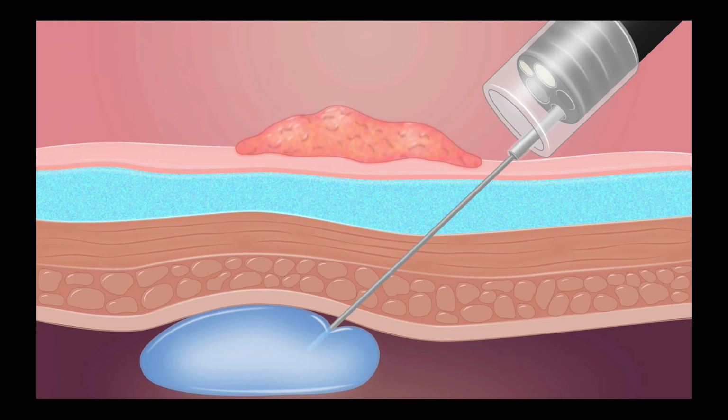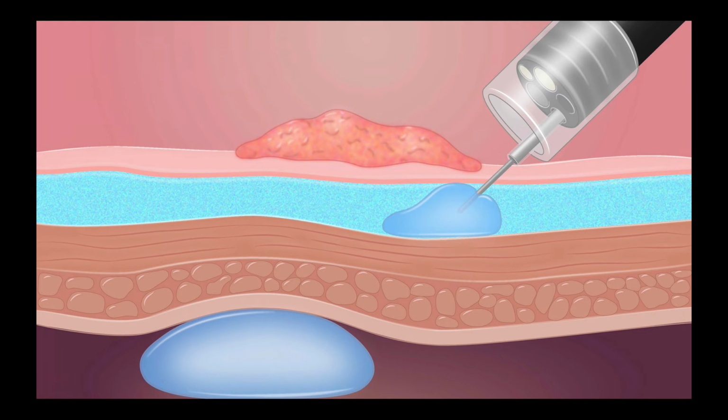Once you recognize that, you will ask your assistant to stop injecting and gently pull your needle back into the submucosa and let him tap so that you could see the submucosal bulge, and then continue with the injection. It's not a good idea to pull the needle completely out and try to find another site.